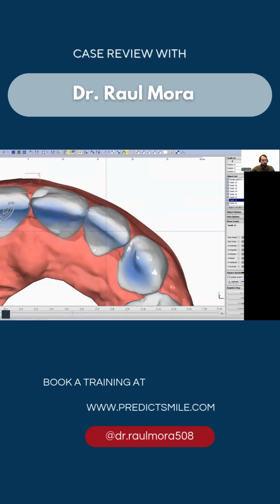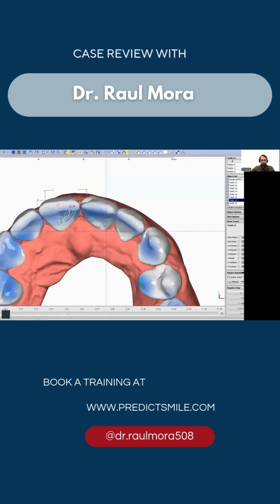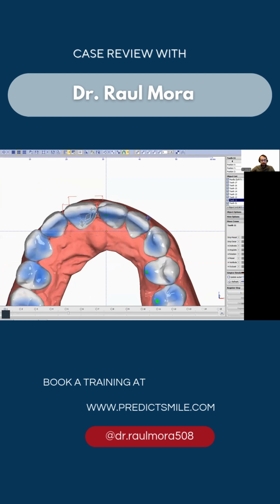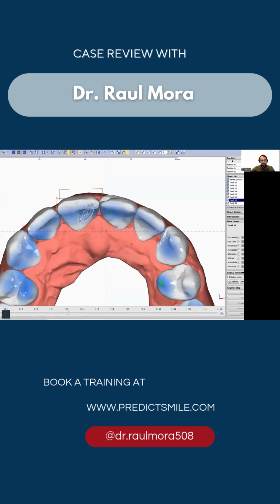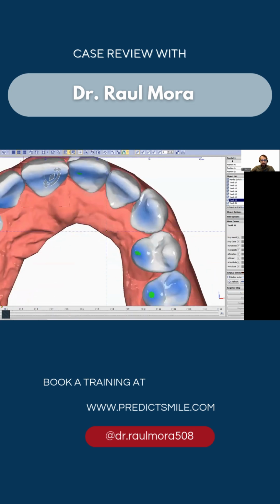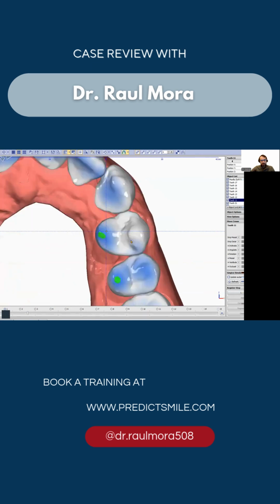So we'll have to see what we can do with the other tooth, and delay the movement of the lateral incisors as well. We're still working in the 15 aligners, so we're pretty good, I think. This should be an easy case, not a complex case. But let's start managing from the canine. You see we have the canine. I always work one side of the staging first and then the other one.